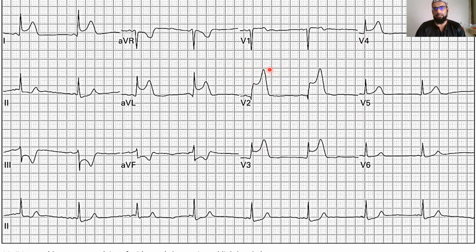Because there's damage, repolarization tends to start much earlier than what would normally happen in a healthy heart. Okay. Oh, and actually, I've made a big mistake that I always advise guys not to do, and that's to look at your right lead as well. And we can see a little drop in AVR.